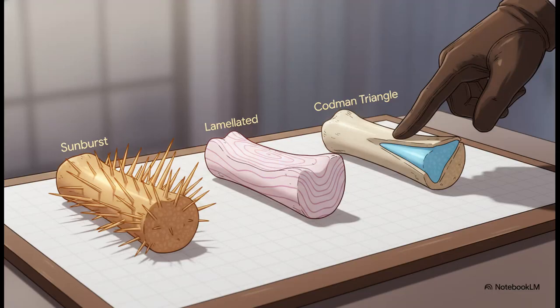And like any good movie villain, osteosarcoma has its calling cards. These are telltale reactions from the periosteum, that's the outer layer of the bone. You might see a sunburst reaction, which looks like spikes of new bone shooting outwards, or a lamellated reaction, which has this onion skin look, or maybe the most famous of all, the Codman triangle, which is this little triangle of bone that gets lifted up as the tumor busts through the cortex.